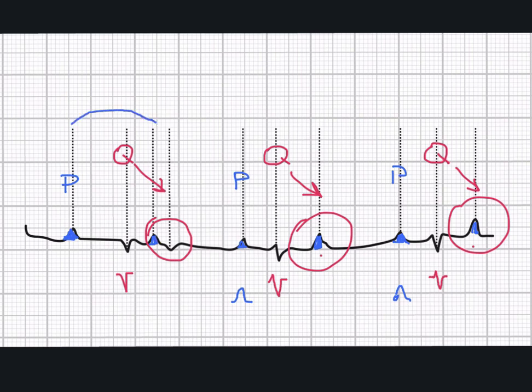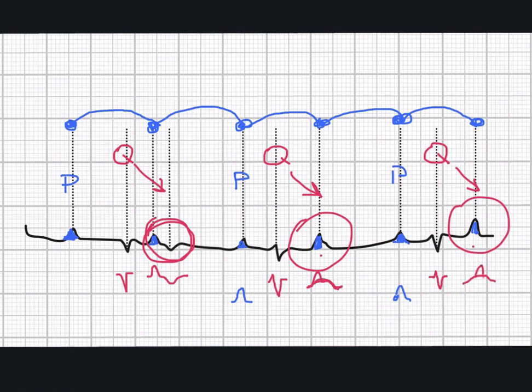And we know from the example just a few tracings back that the P waves usually come at regular intervals. So there's one P wave here, one P wave here, one P wave here. And now we must say that what we have called T wave here is a mixture of a P wave plus a T wave. And the same thing is here. There's a P wave on top of a T wave. And here we have a P wave on top of a T wave.